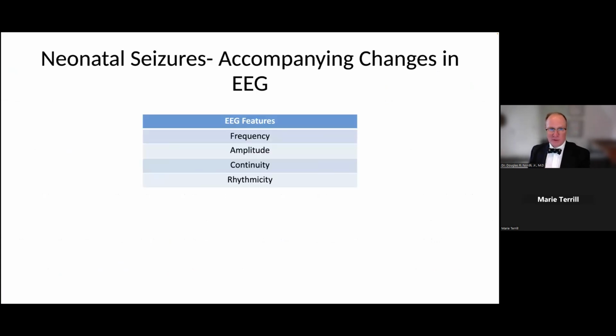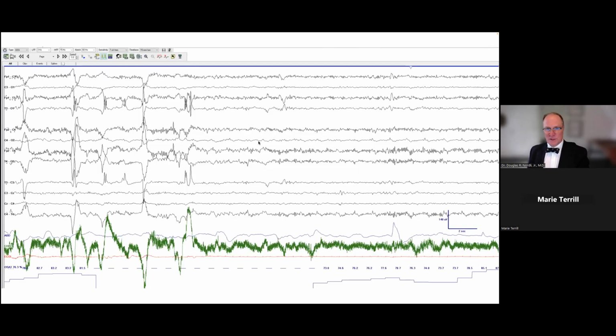So one example is neonatal seizures, and you can think of it in a variety of different ways. But the thing that stands out to us in a neonatal study is that you don't have any sustained rhythmicity in the normal newborn recording. So that's one feature. Two, you get an increase in the continuity, particularly of higher amplitude activity, which is going to become significant with the trends. And three, because of this rhythmic activity, you see a change in the frequency domain that accompanies these.